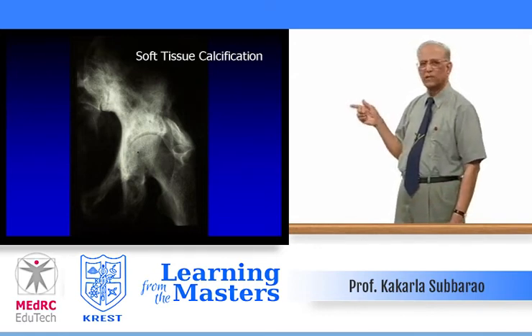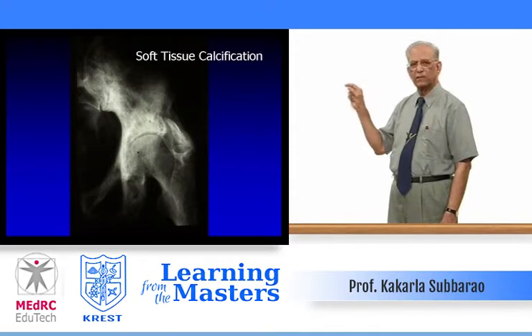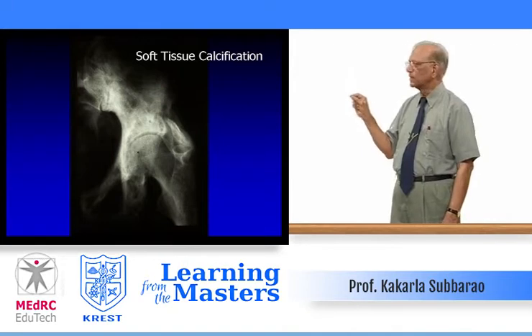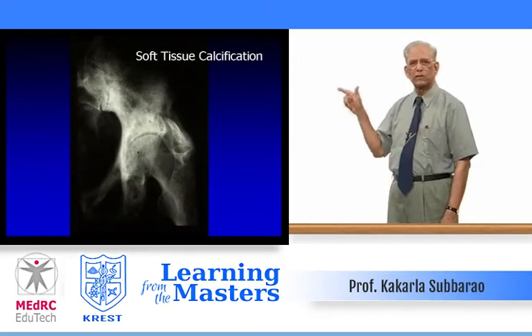Soft tissue calcifications: look at the area above the greater trochanter, a strip of calcification or ossification. A mild avulsive injury, ligamentous injury or tendinous injury produces dense calcification. Not only just calcification, it is involved by the pagetoid process. It is not normal calcification.